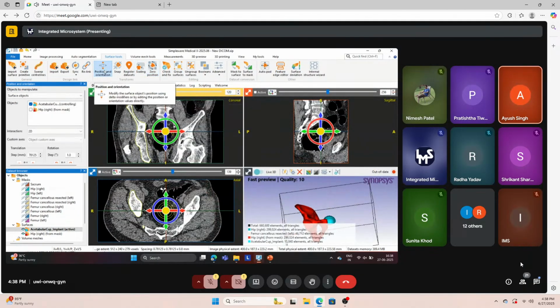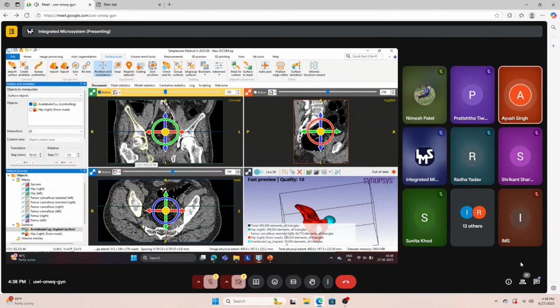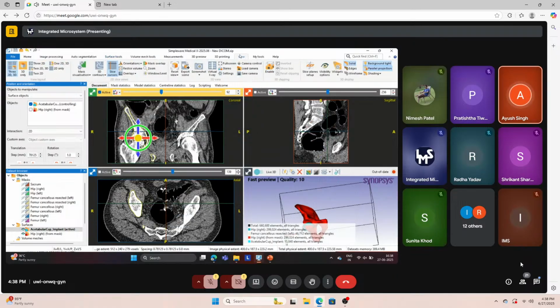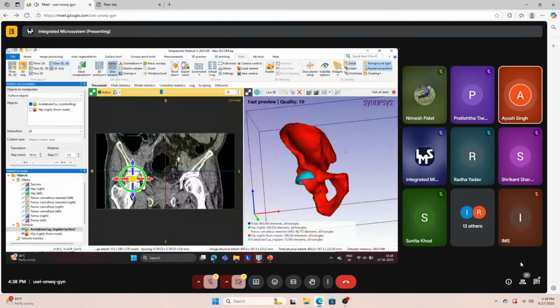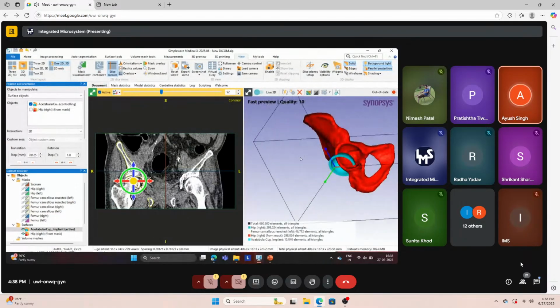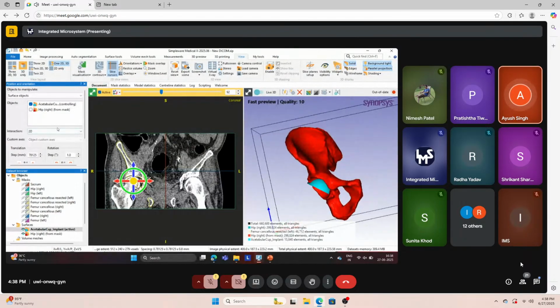Some might be familiar with positioning in the 2D view, so we do have the support over here. We will always see whatever task we are doing in the 2D and 3D views. For example, if we make a modification in any of the views, we can see the resulting changes in the other view. This way the positioning and orientation is very accessible for us.